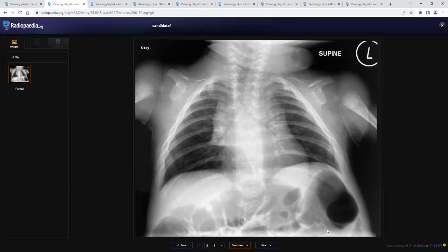Chest skeleton bilaterally also appears unremarkable. Subdiaphragmatic region revealed increased bowel gases. However, there is no evidence of pneumoperitoneum or portal venous gas detected within this film.